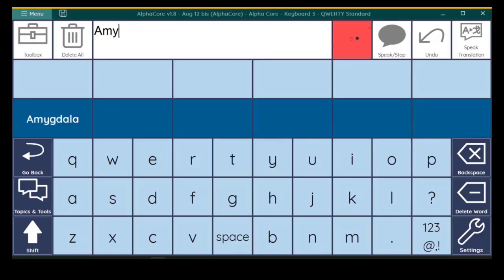When using dwell selection, remember to select your pause button whenever you go to a new page so you have time to look over the page at your own pace.